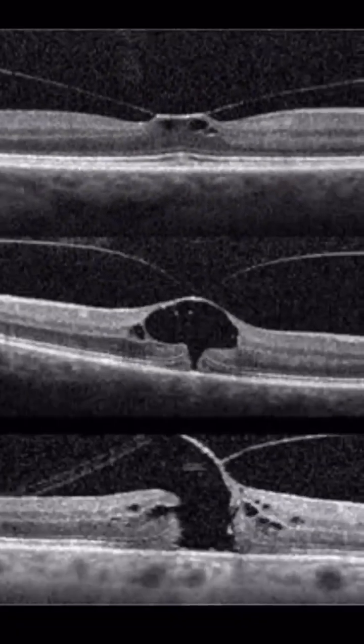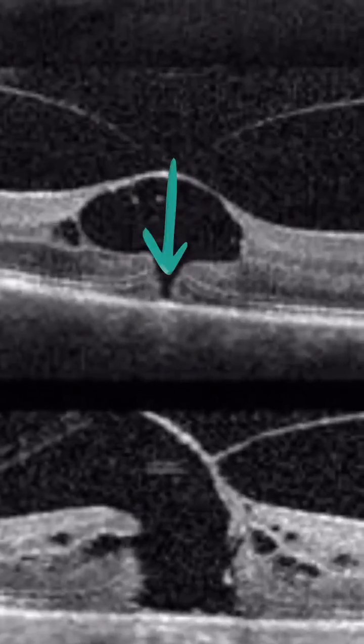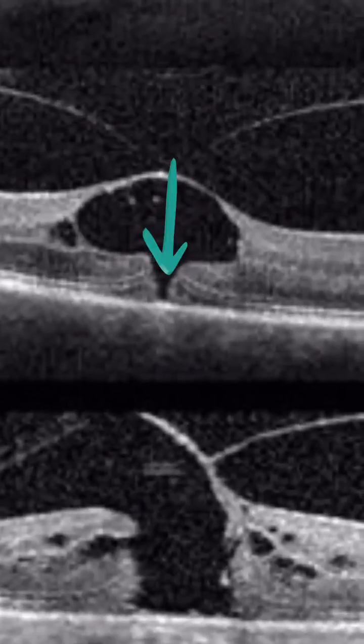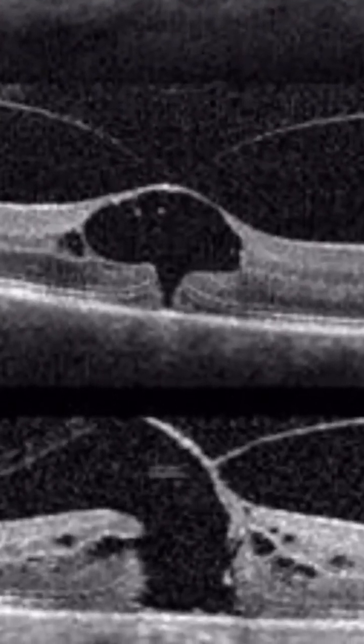Now, if you go on the middle scan, you can see that there is further traction. However, the ISOS, as you can see here, that line starts to be disrupted centrally. There is an area of missing ISOS. Then you can assume in that eye, the patient doesn't have so good visual acuity, or actually the vision starts to go down because of the lack of photoreceptors centrally.